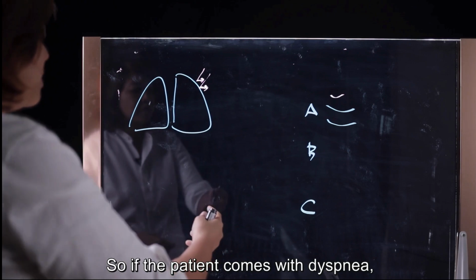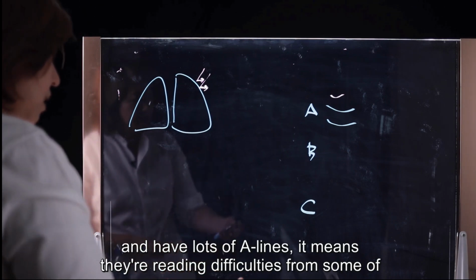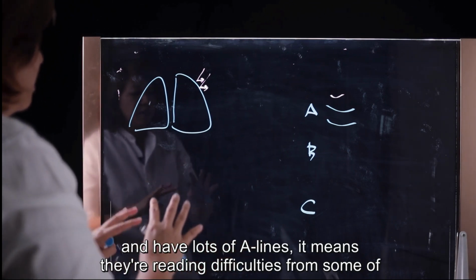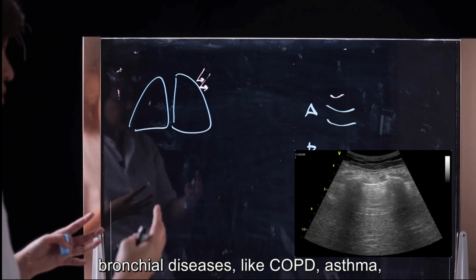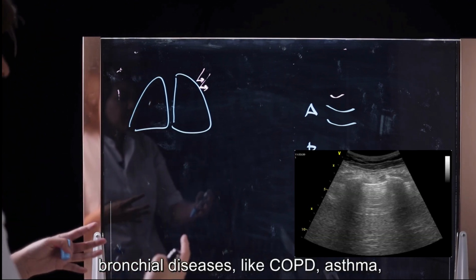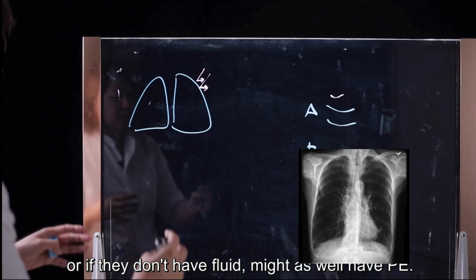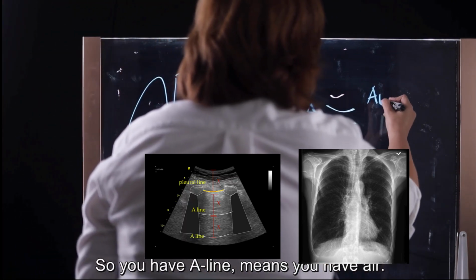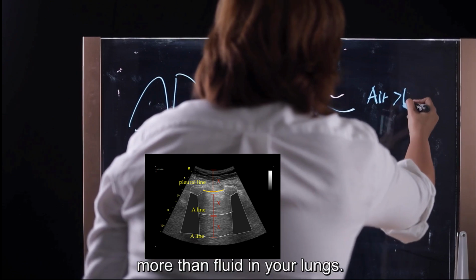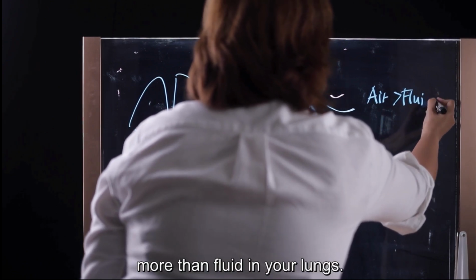So when patients come in with dyspnea and have a lot of A lines, it means their breathing difficulty is from some bronchial disease, let's say COPD or asthma, or they don't have fluid. Let's say maybe they have PE. So if you have A line, it means you have more air than fluid in your lung.